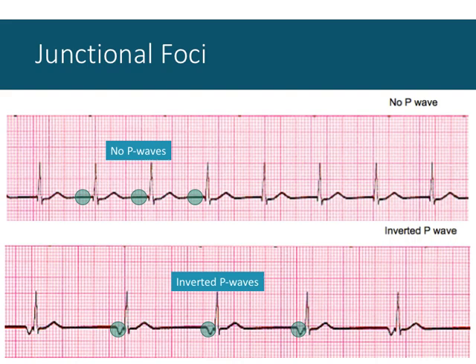Yeah, so go ahead. The no P wave, is that more fatal than the other? I wouldn't say it's more fatal. I wouldn't say either of these is necessarily fatal. They both result in no atrial contraction to aid in the pumping of blood. So it disconnects atrial pumping from ventricular pumping. Even in the second example, where the atria contract, the ventricles are contracting, so the valves are closed. There's no more blood getting into the ventricles to be circulated.